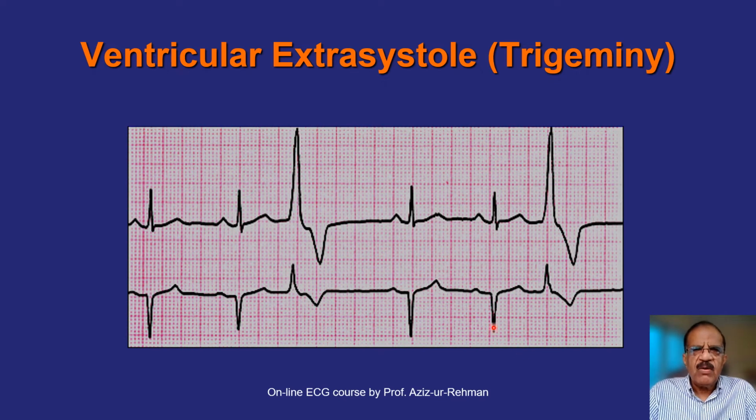What is this? Very similar, but here two sinus beats are followed by one ectopic. Two sinus beats followed by one ectopic. The same ECG here. So this would be called a trigeminy. You have the impression that a cycle of three beats repeats itself. So it's a trigeminy.